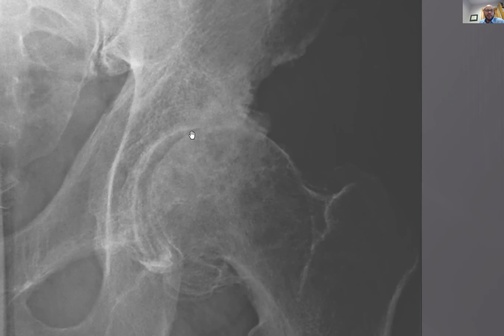Okay, that's a good answer. I mean, it's a gutsy answer because, you know, the academic guy in me is going to say, of course it matters. I always want to be right. But the answer is, you know, that hip is shot. That is bone on bone, constant pain. If there's AVN here, he's going to probably need a new hip anyways.